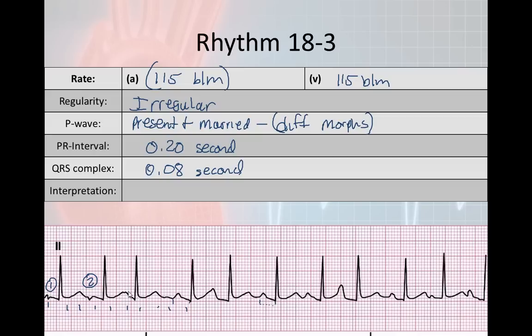I'm going to say no. If you look over here and see this P wave buried in the T wave right here, what is this morphology? I don't know. That's the problem. So let's go ahead and skip that one and come back to it. This is a 3. That's your third different morphology. Let's see if we can find another one. This one, we have no idea, so we're going to have to consider not using it for now. So that's a 3 right there. That looks like a 3. Can't really tell what that is. No idea what that is, because that's buried in the T wave. That might be a 3. Do we want to call it a 3? Yeah, we will for fun.